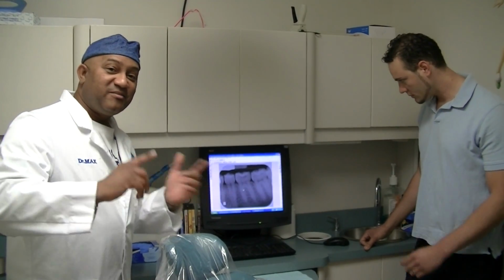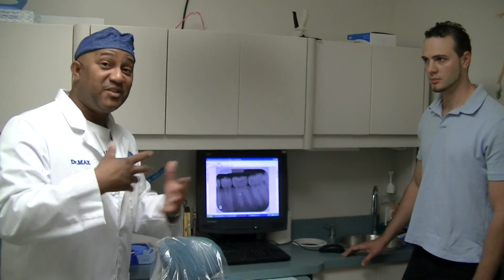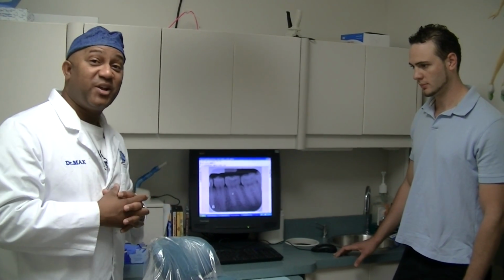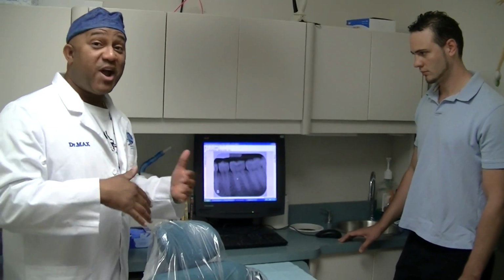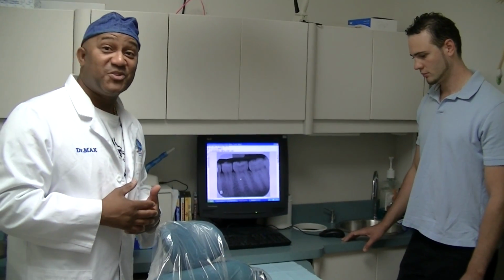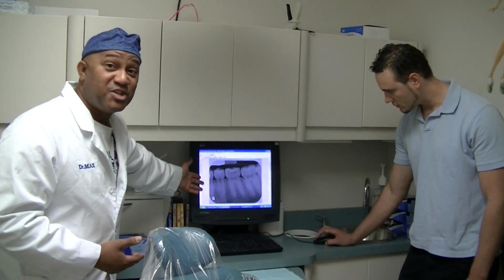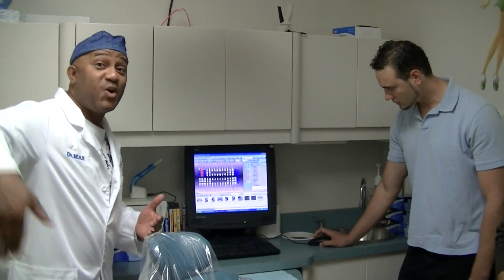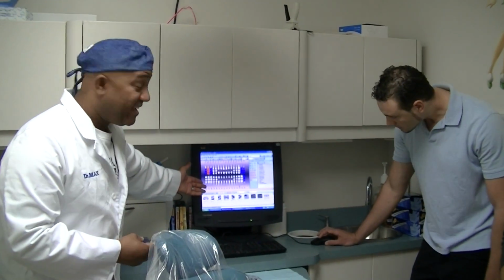So we can just walk over to the other room and we'll show you exactly that process of when it gets scanned in when we leave this particular location. It shows you how it's integrated. All the computers in the office are all integrated, so it's all part of the software. It's nice to have this integration where no matter where I am within this practice, I can be here and one of the other clinicians on the other side has a question for me. I can bring up another patient's information right on the screen while we're waiting for anesthesia, for instance, rather than walking all the way over to the other side. I can pull up another chart instantaneously.